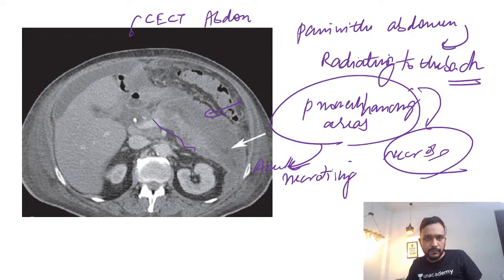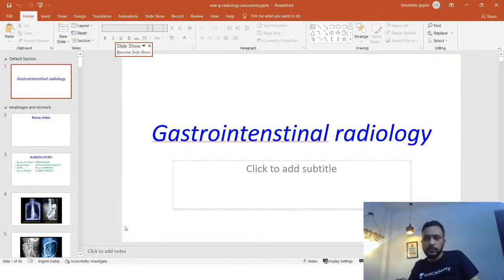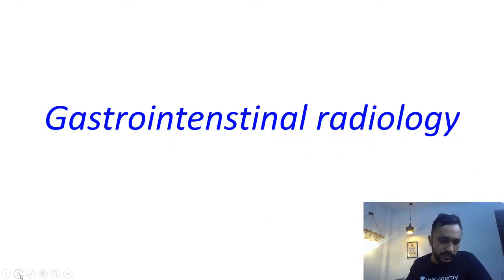Okay, so guys, these were the few important images from the section of hepatobiliary radiology. Now I am going to discuss with you few important images from the section of gastrointestinal radiology.